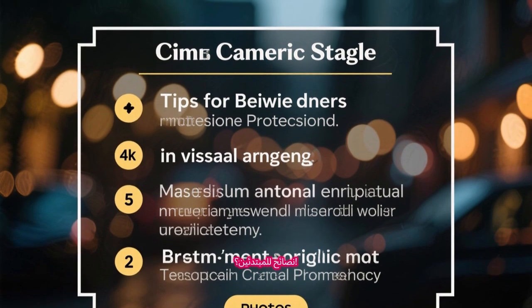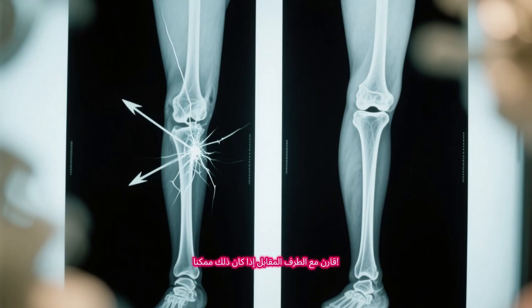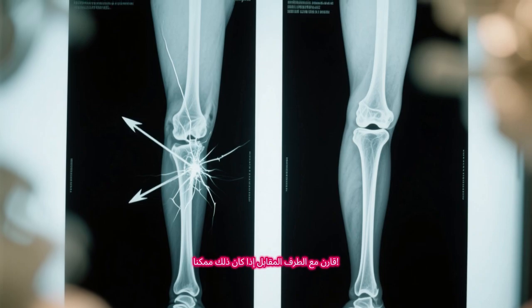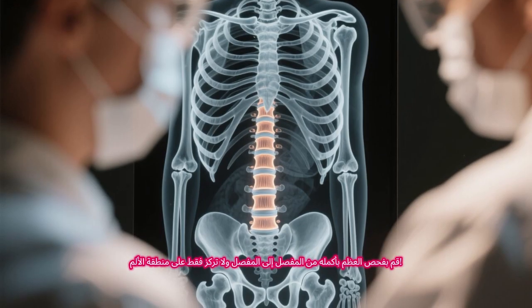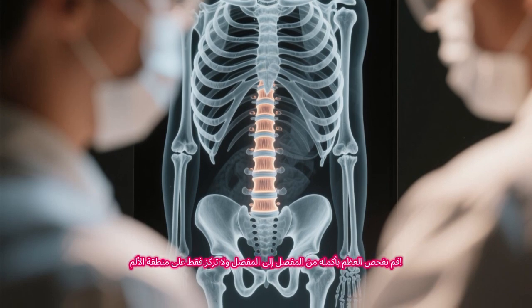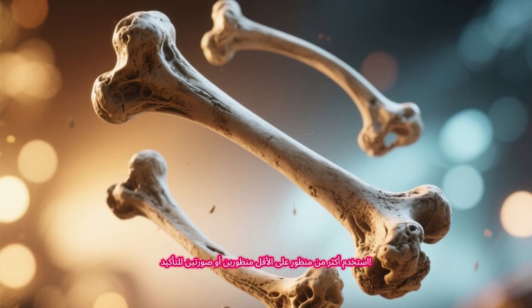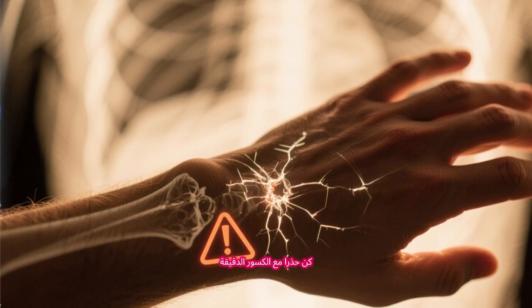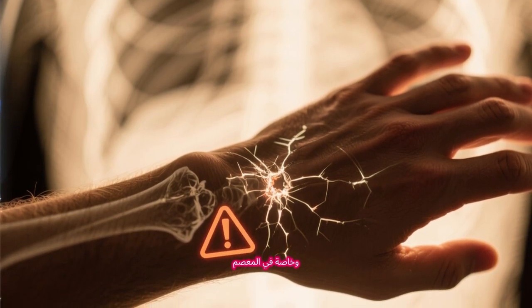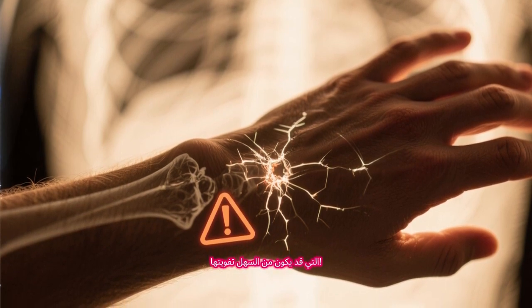Tips for beginners. To avoid missing fractures, always compare with the opposite limb if possible. Check the entire bone from joint to joint. Don't focus only on the area of pain. Use multiple views, at least 2 views to confirm. Be cautious with subtle fractures, especially in the wrist, ankle, and ribs. They can be easy to miss.